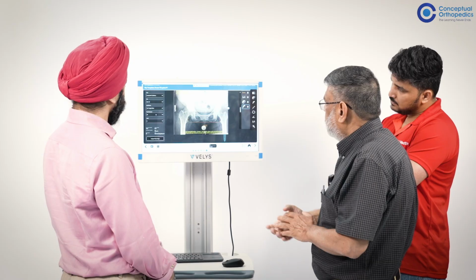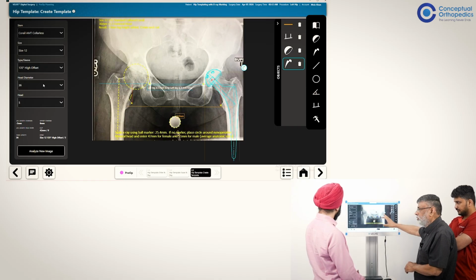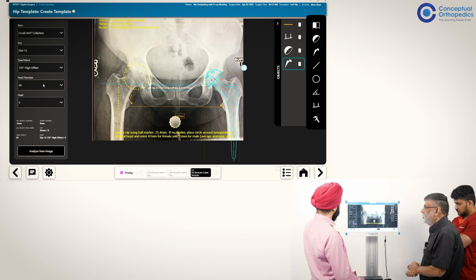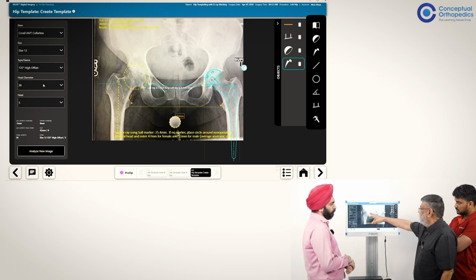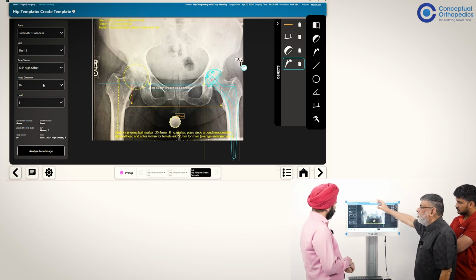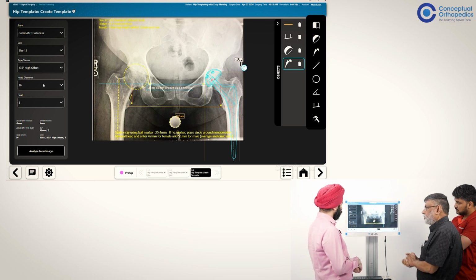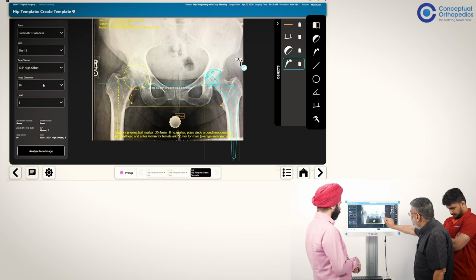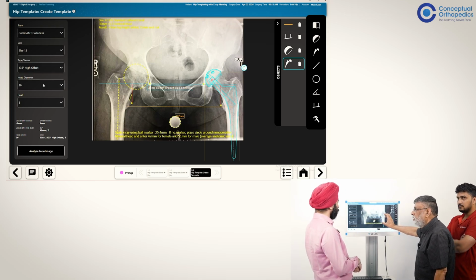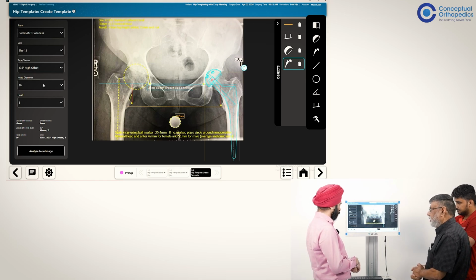So we only want to increase 3 millimeters from whatever we are getting here. And if we get that, we will be happy with this. In some situations, if it is very arthritic, we may want to increase 4 millimeters, 5 millimeters, depending on where it is, and then obviously also where it is fitting. Sometimes it is fitting in a place where there is a gross difference, then you can change it by changing your version or the length. Understand this?